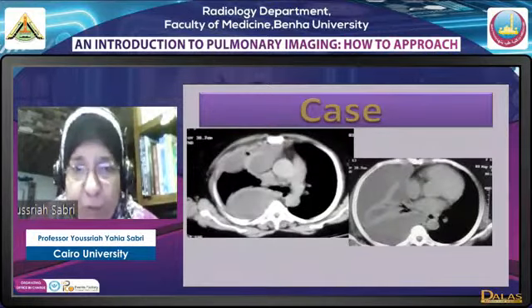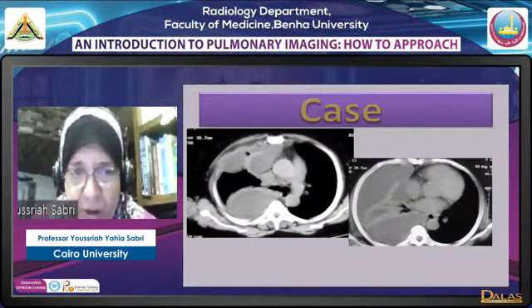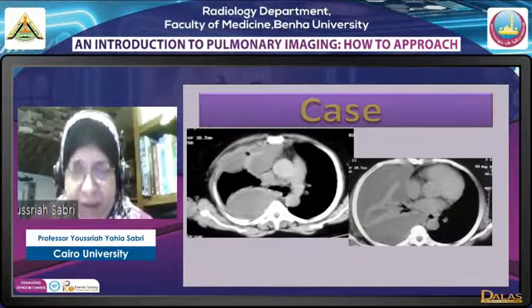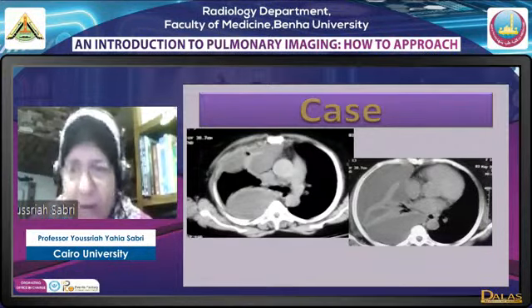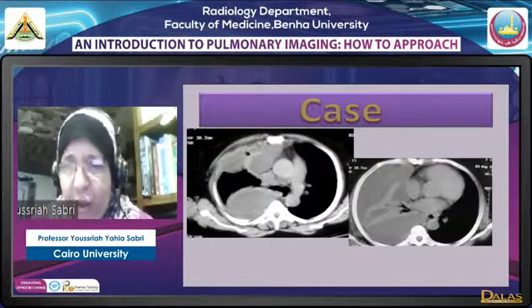Now here we have two images of the same patient. Of course, the right side image, as you can see, has loculation, which is so clear, and even a dense pleura, while the remaining effusion basally is free. And this is something that you see a lot, partial loculation of an effusion.